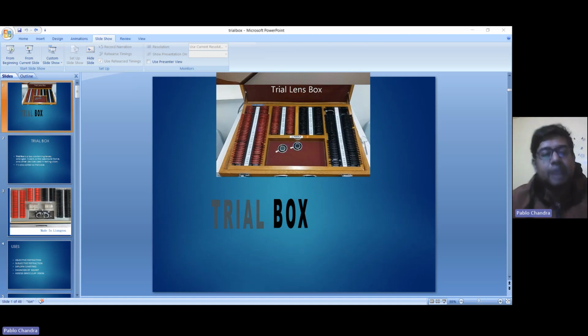So there are two types of trial lenses. One is the full aperture lenses, another is the reduced aperture lenses. Why do we need full aperture and reduced aperture? I'm coming to it. So this is a full aperture. You can see there is no rim. Only the metal lining is there, approximately 38 mm, biconvex, biconcave form. They do not conform to any of the additive lens principles preferred by many practitioners. Do not obscure the patient's face, heavier and thicker, large additive error.